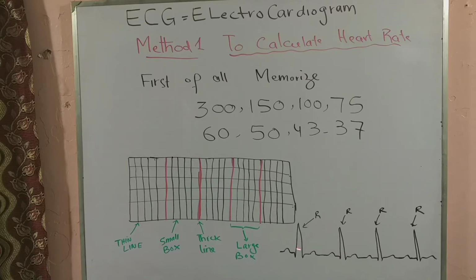and third, whenever you see a tracing of the ECG, it will comprise the P wave, QRS complex, and T wave. The R wave is the tallest wave in most of the ECG leads. If there is no R wave, it will be the S wave, like for example in the case of V1 and V2. So here we are taking the example of the tallest positive deflection, which is the R wave, but where you don't find the R wave, you can take the help of the deep S wave. So these are three very basic important things to remember.